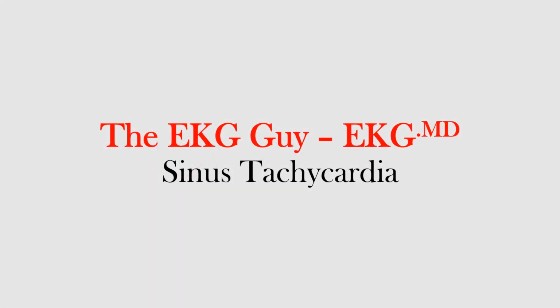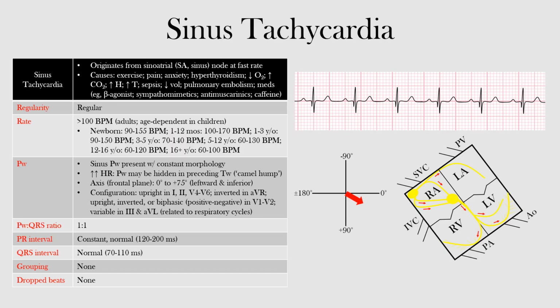In this lecture, we will discuss sinus tachycardia and how it would normally appear on the EKG. Sinus tachycardia is similar to normal sinus rhythm. Both are sinus rhythms, but have varying rates. The sinus beats in sinus tachycardia occur above the normal heart range, okay? Otherwise, everything else should be the same as normal sinus rhythm.